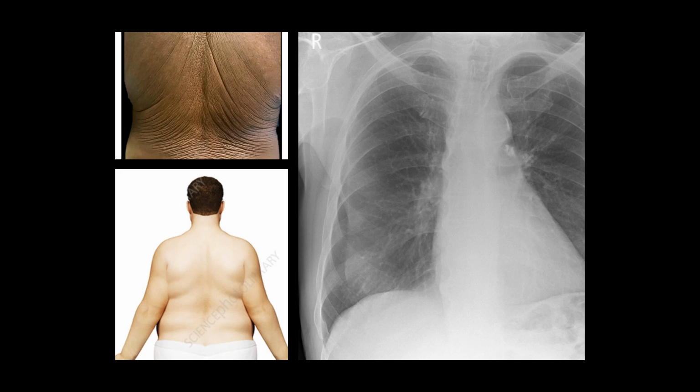One thing that can sometimes trip people up is this kind of situation. We see this crisp line and someone could say, aha, pneumothorax. You see this is darker than this, bam. But no, that would actually be wrong. If you look, even though it's a crisp line, it is not a thin line. This is a very thick region here of a more dense tissue. And what we're actually seeing here is a skin fold that winds up having this very crisp edge.